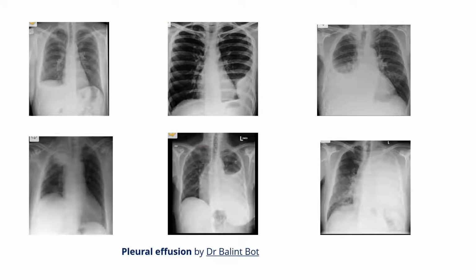Now, the question is, with decompensated heart failure, which location of pleural effusion are we going to expect? Left or right or both? Right. More on the right, yes. More prominent on the right, which is on this side here, than on this side here.